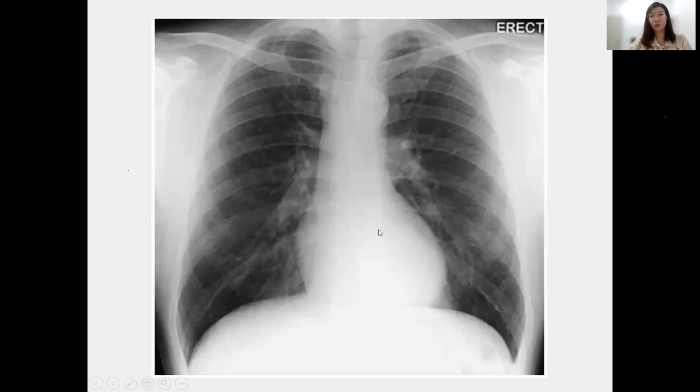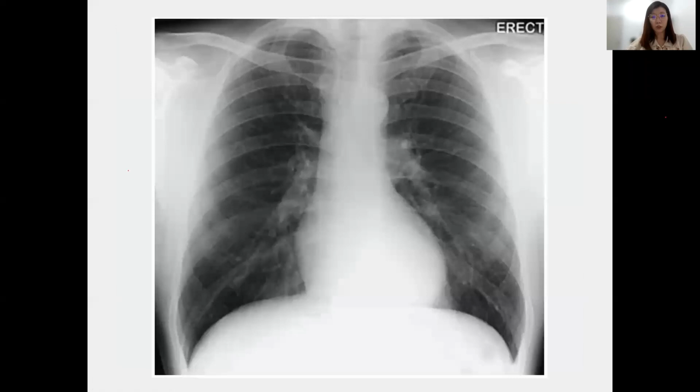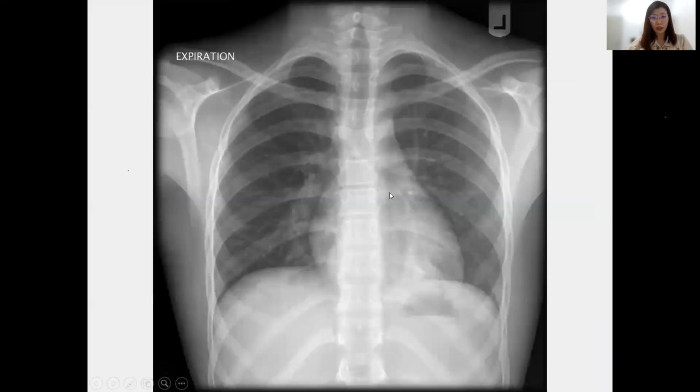From lung or from posterior mediastinal. All right. So another thing will be, look at this quite fairly normal X-ray. Another thing will be the paraspinal line here. Always review this line because some of the opacity can arise, just a small bulge here, okay?